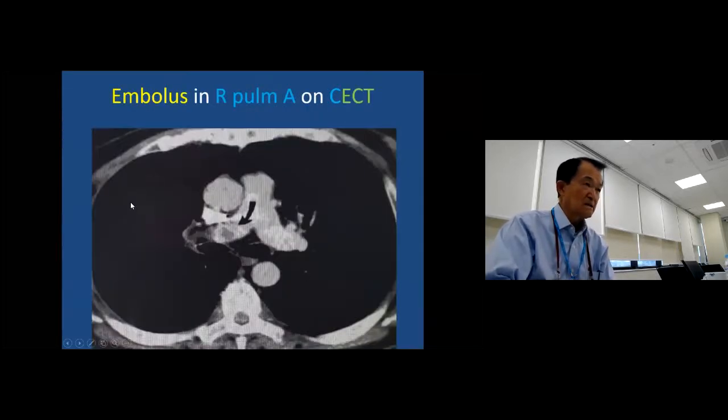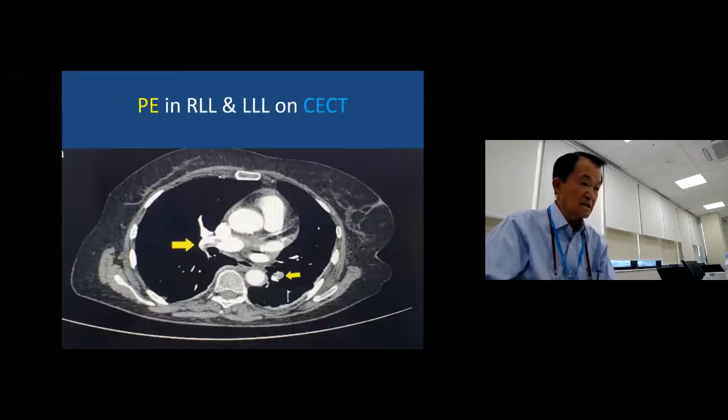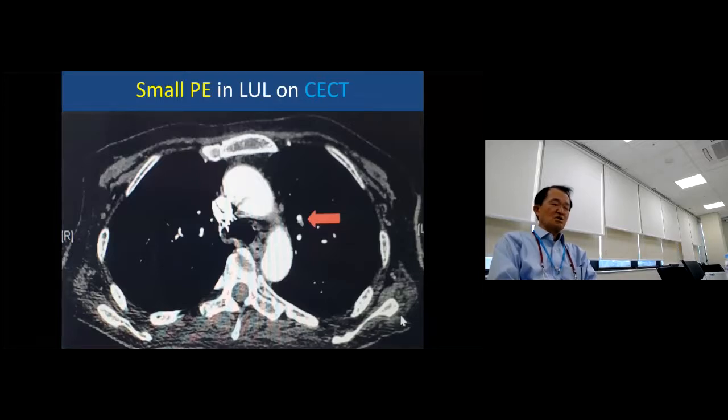But now see here is a major pulmonary arterial trunk on the right side, and that certainly requires therapy. But there are many small blood clots in small vessels. This one is not that small, but tiny ones are incidental, particularly. When I was at MD Anderson, almost every CT for lung metastasis showed blood clot, every case.